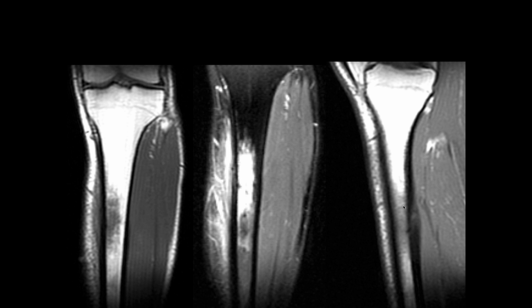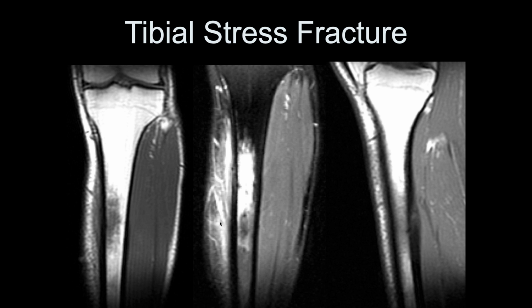All right, here we see some bone marrow edema of the mid-tibial diaphysis, and it's actually extending within the muscle as well, right there. And I don't see a fracture line, so this could be a stress injury.